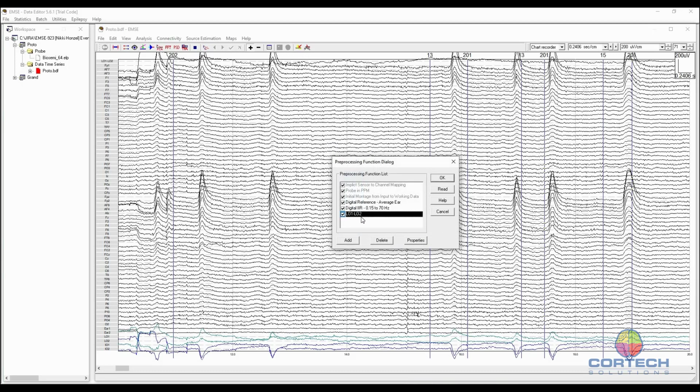And finally, I added this for the sake of anticipating the horizontal EOG correction in the third script. We'll see how this is. But we still have our LO1 and LO2 channels individually. And it turns out we don't really need to make a bipolar channel to do blink correction. On the other hand, for the horizontal, it is very helpful to have a bipolar, as we'll see. So basically, it's deriving this channel now that's showing up on the top.